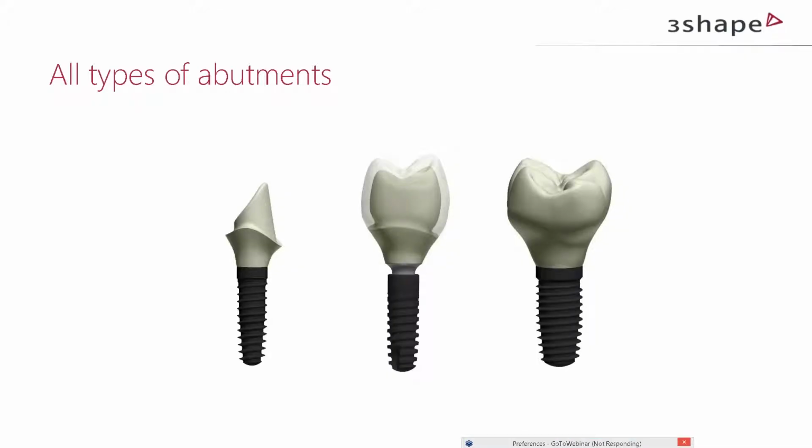Apart from healing abutments, we of course have access to a full range of abutments. It doesn't matter if it's going to be a customized abutment with a cemented restoration, or maybe screw-retained restorations, either in full contour or with layered material on top of it.